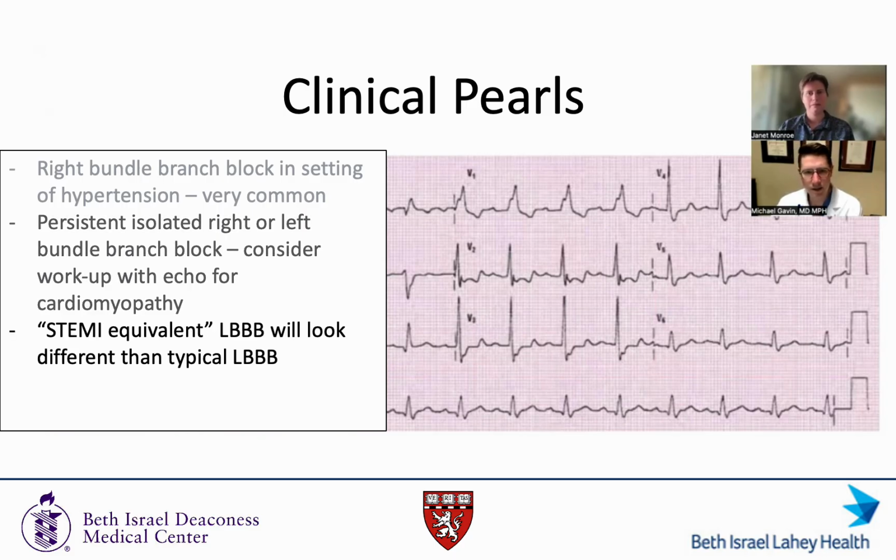So when you melt the conduction system via a large anterior wall infarct, there's some ST segment elevation typically hidden in there. It's usually a right bundle, left anterior fascicular block, but you have elevation here instead of the standard depression. They're a little uglier looking. So a left bundle is not a STEMI equivalent. It just means you can't interpret what's going on underneath it.